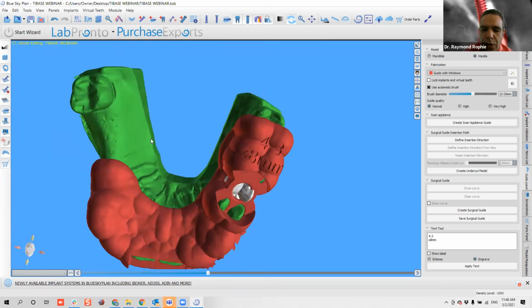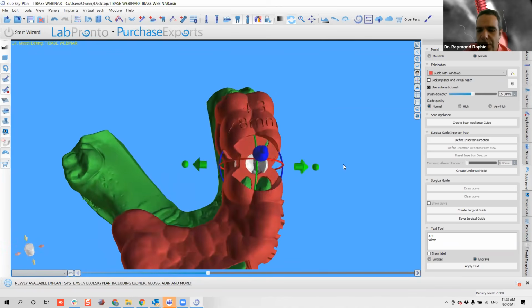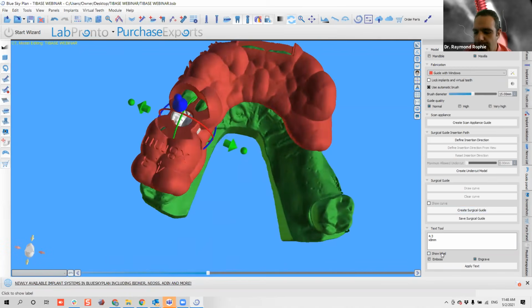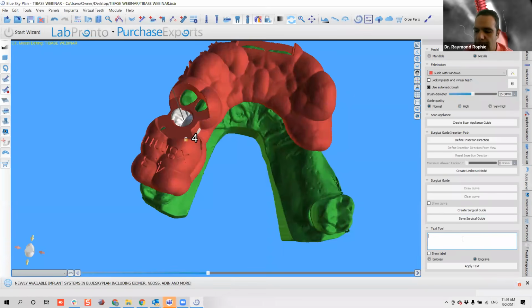So now there's a ton of guides that I see that usually you put the label. So let me now put, this will be the implant. But now, if you remembered, we changed the offset, right? We changed the offset to a 10mm. So I need to remember that. So I will just group here 10 offset.